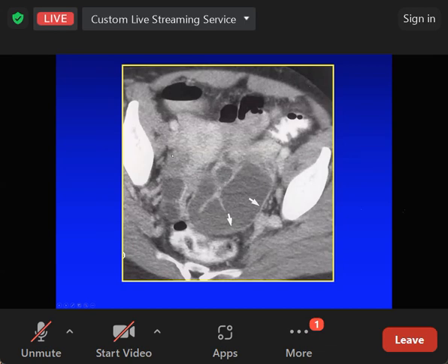Right, okay, we've moved from the upper abdomen down into the pelvis, and this is, I'll tell you for free, a female pelvis, and here we've got fluid in a tubular structure, which seems to be acutely angled here. This is a typical hydrosalpinx, or in this case, I think this was a tubo-ovarian abscess because the patient was septic. So we can't really distinguish easily between pus in a tube and fluid in a tube.